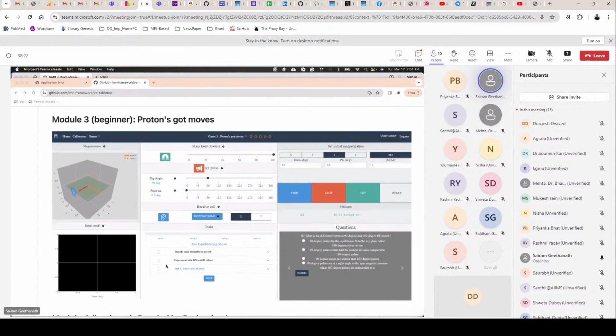You can change a bunch of these things and look at it not in the rotating frame but in the laboratory frame of reference. For those of you who've not looked at these vector diagrams, the idea is for you to get a sense of how magnetic field strengths, like the two different magnetic fields, at least B0 and B1, interplay and what that does to your magnetization.